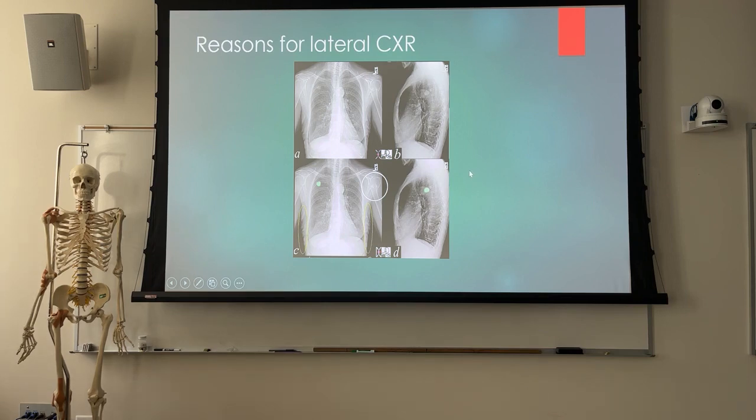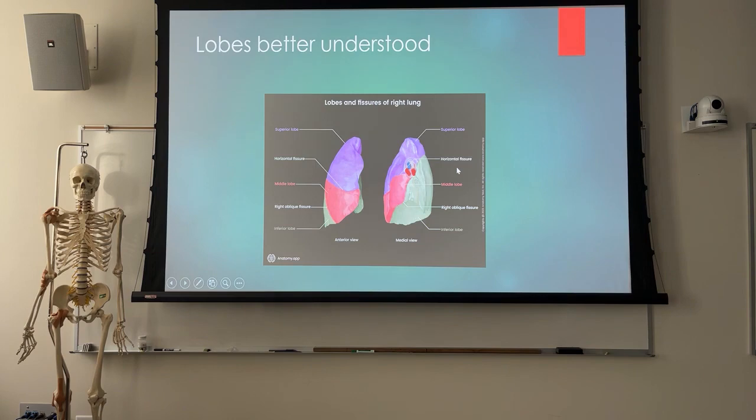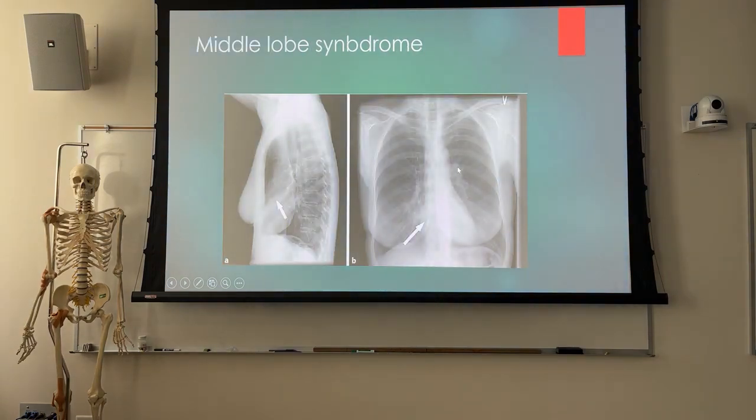So do we need a lateral on absolutely every patient? Yeah, probably not, but is it still useful? Yeah, it is. Okay, so somewhere in between, every lateral is useless and every patient needs a lateral. The truth pretty much lies. Okay, so just more of the same stuff.